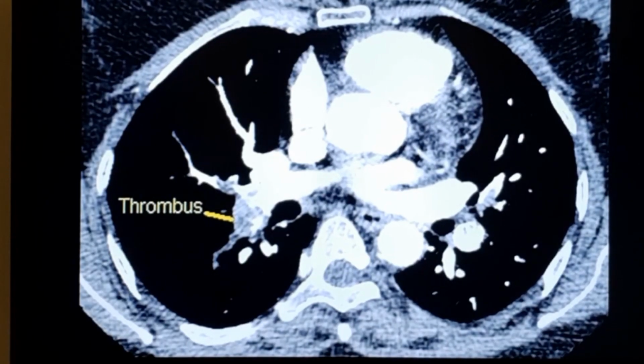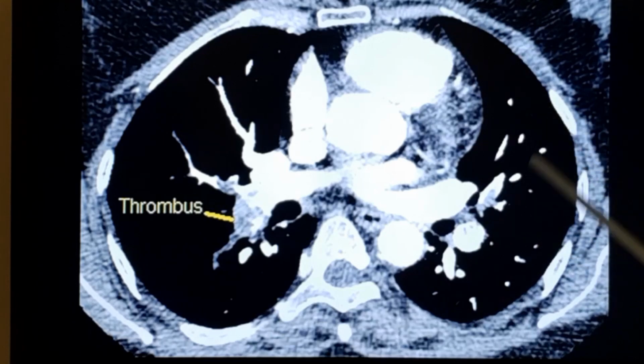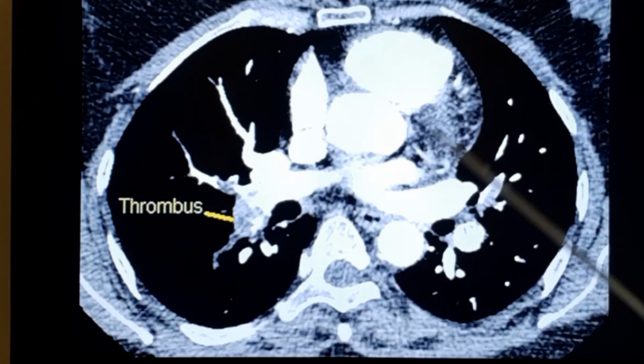This is a section from a contrast enhanced CT of the thorax. These are the cardiac chambers. This is descending aorta, vertebra, and the rib cage. Lung is not seen well because this is not a lung window. It is a vascular window. Only the contrast enhanced regions are seen. Myocardium is seen as partially contrast filled.